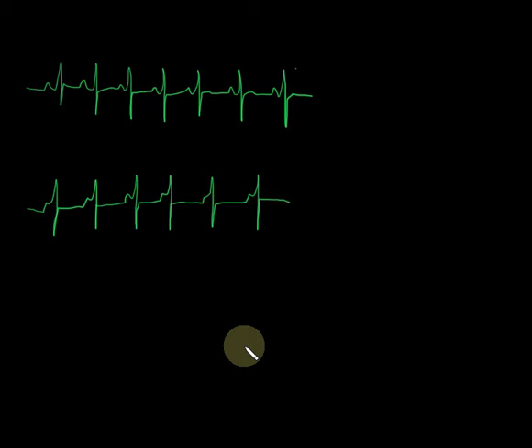Okay, so the QRSs on here are still narrow. I have P waves, and they are upright, but they're pretty much embedded right within the QRS here. So P to QRS ratio, though, is 1-to-1. Every time I have a QRS, I have a P wave in front of it. Every time I have a P wave, I have a QRS that follows. But the PR interval here, if you look, again, hand-drawn, you don't have the grid, humor me and say this is about a 1 to 1.5 block PR interval.